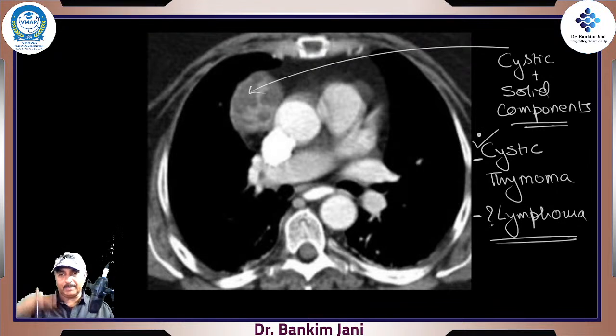So you have to see the upper and lower cuts also, so that you can see the total extent. But even if you say whether it is cystic thymoma or lymphoma, things are clear. Then accordingly, you go for the further diagnosis, right? You go for PET or whatever.